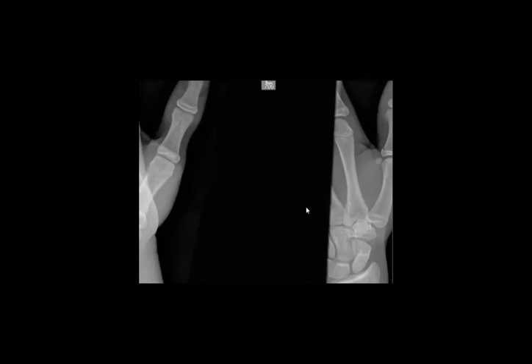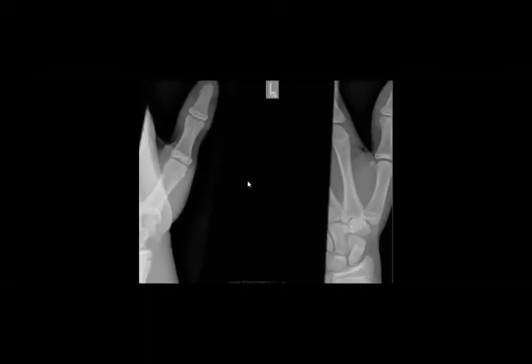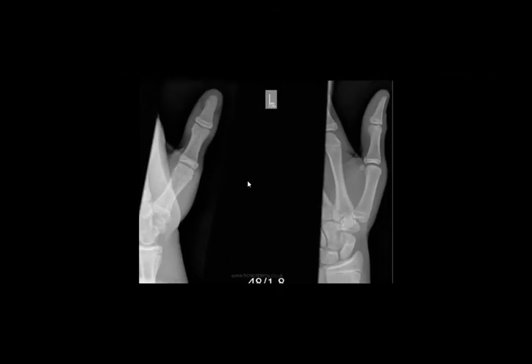So, type 2. Okay. And if I told you that it is already crossing the epiphysis as well, it will be? Type 3 or 4? Epiphysis means 3, and metaphysis, epiphysis, physis all crossing means 4.